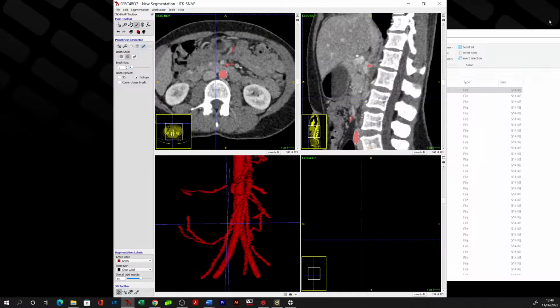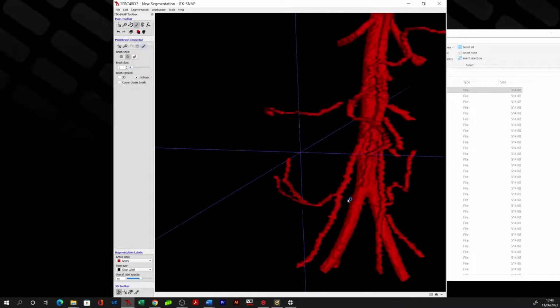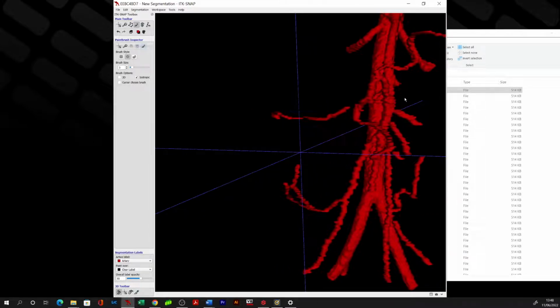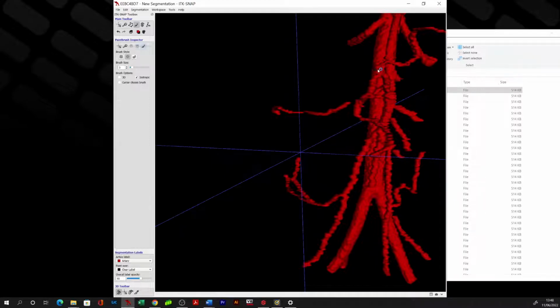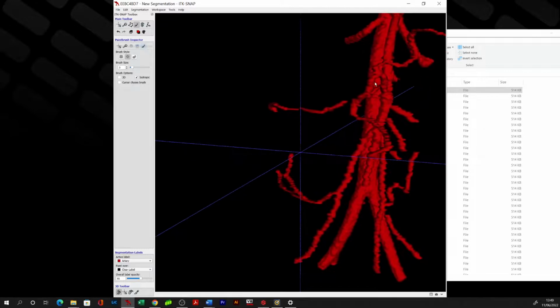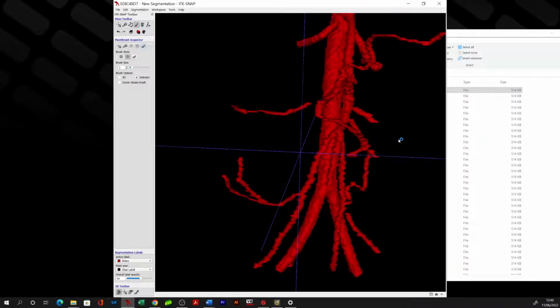Okay, so I think we've made some good progress now with the arterial system. This would be fairly classic. You've got the short arterial trunk here. You've got the bifurcation into this left branch, which is passing towards the distal transverse colon. And then you've got this secondary branch, which then bifurcates into a branch supplying the hepatic flexure and the more proximal transverse colon.